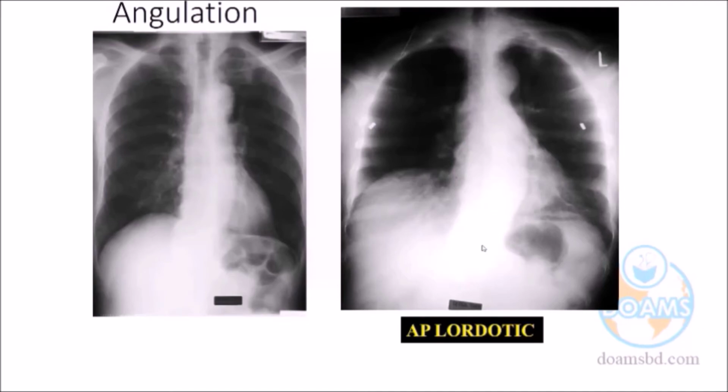If I were in front of you live, I could show you how to stand, just like an English lord, placing the upper part of the body back and the lower trunk projecting forward. This is the lordotic position, and the clavicle is as such.